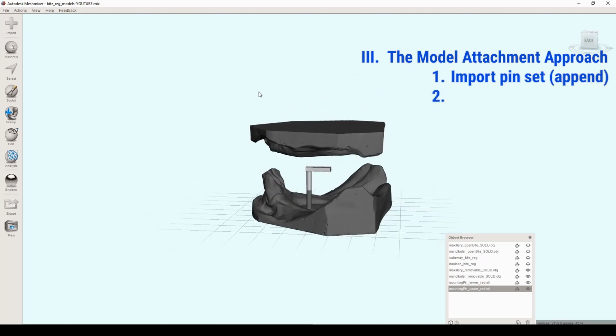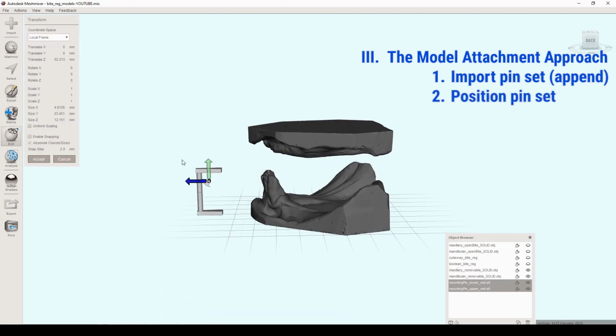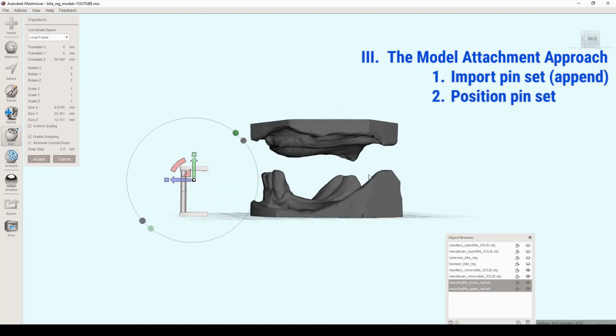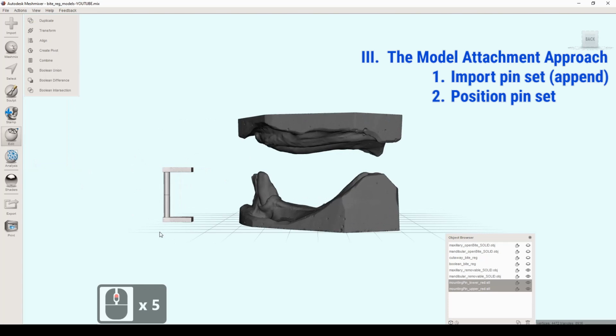Okay, so we have our one set here. I'm going to hold Shift, select both of those, hit T, translate this out just so I can kind of see what I'm doing. It's too short, clearly, but that's the one. So let's just do one first, and then we can just copy it 3 times and do a tripod. So I'm going to hit accept here just for now. That looks fine.